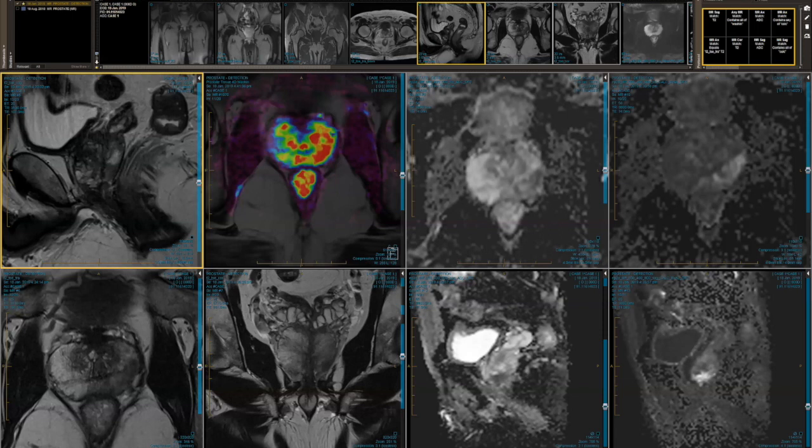Could I just add something there? I think as radiologists, we are always looking at the clinical details. And one of the things that I look at really carefully, if I do think the MRI is negative, is some reason why they may have felt the nodule. So it may be that there's asymmetric transition zone. Sometimes there are transition zone nodules in the peripheral zone, which will be palpable. There may be calcification in the prostate. There may be periprostatic abnormalities that may account for the DRE findings. So I would try and put in the report some relevant negatives if I felt the scan was negative, yet there was a DRE abnormality.